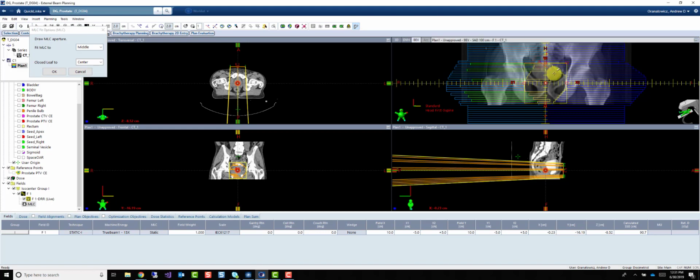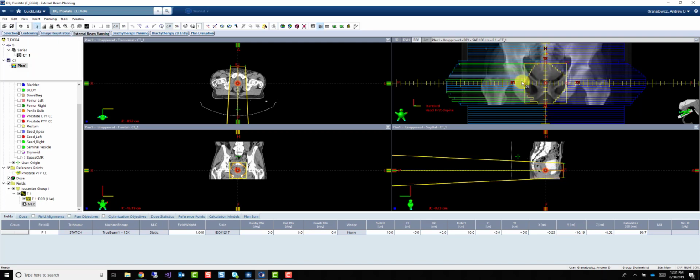If I again wanted them to bounce to this zigzag line, but I accidentally close around this way, let's watch what happens. They followed that line that I closed with because that's the nearest line to the MLC. So you always, this first line that you draw, if that's the line I want them to bounce to, you close around back so that they hit that line first and go to that line.